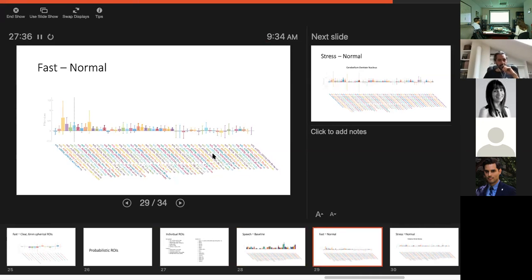If the line is not black but shaded darker, does that mean it would be significant but uncorrected? Right, exactly. It has 3 levels. If it's all gray, it's not significant. If it's a little bit darker but not quite the standard color, that's significant at the individual level, but not after the FDR correction. And the ones shown in full color with black error bars are significant after the FDR correction. I'll add an option to specify your threshold in a more clear manner for these results.